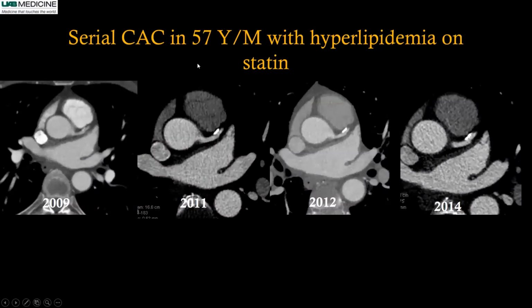This is another 57-year-old male with hyperlipidemia, and this was his baseline CT. Why did he get CT? He's asymptomatic, self-pay. Because he goes scuba diving every year, and he just wanted to make sure everything is fine. And this is the best way to do it non-invasively. So you can see a very fine speck of calcification, non-obstructive, and he was fine.